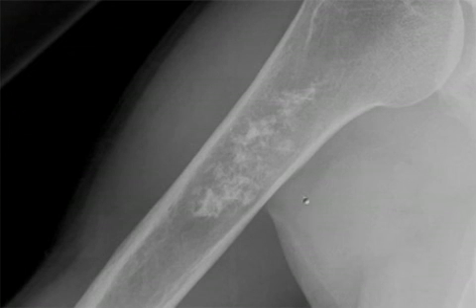This is a pretty characteristic look for a chondroid lesion of bone, and most often when we see these are benign enchondromas. However, as patients get older and the lesions may get larger over time, the appearance overlaps with a low-grade chondrosarcoma, and surgical management may be needed.